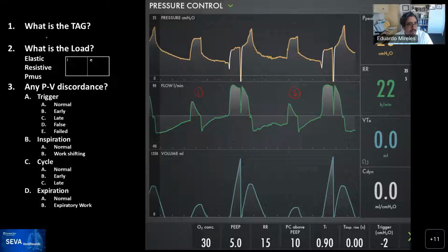Absolutely, I think that you're right on. This is pressure control. Again, the flow is not being controlled, we're controlling the pressure. Even though you see all these aberrancies over here, we'll talk more about them, but in these two that are passive, you can see them, and then when you see the flow, none of them look.